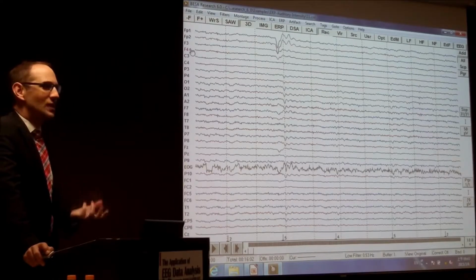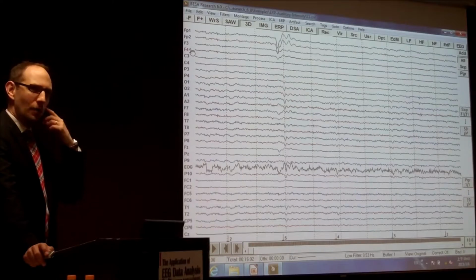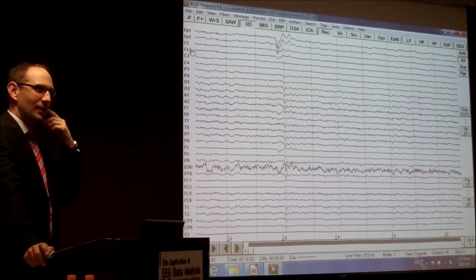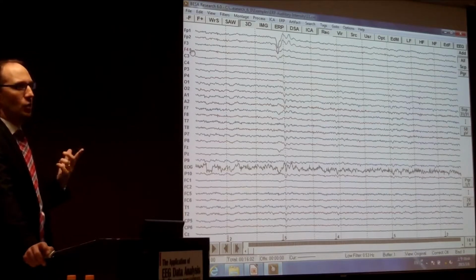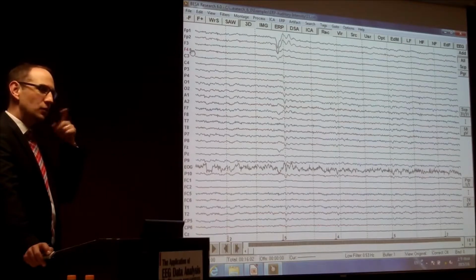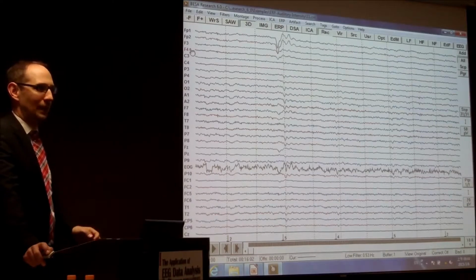But there's a downside on the whole thing. So if you want to interpolate an electrode at the rim of your electrode set, then you will get a problem because there are just 2 or 3 electrodes on the one side surrounding, but not on the downside. And then it will be distorted, and maybe the explanation is wrong. So what we recommend, electrodes on the rim, if they have a bad signal, please do not interpolate, reject them, set them as bad.